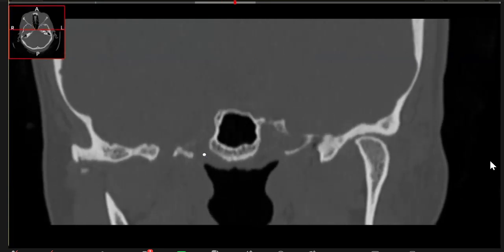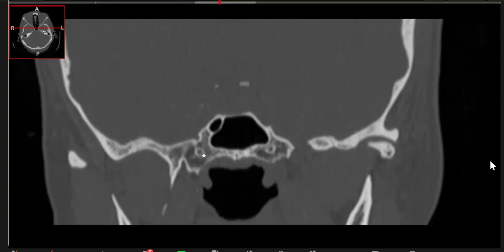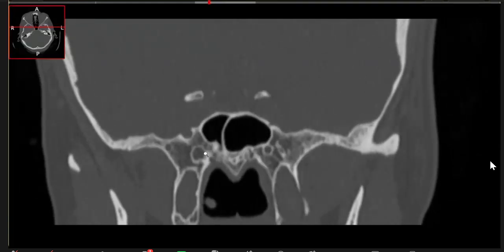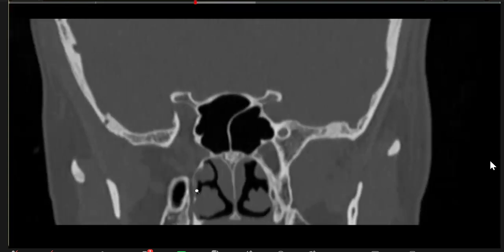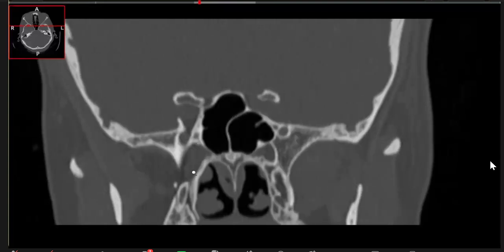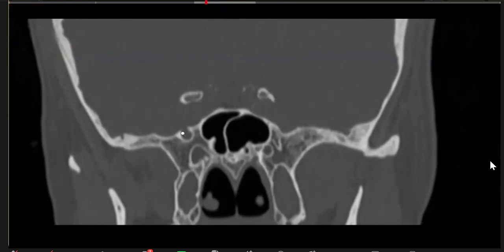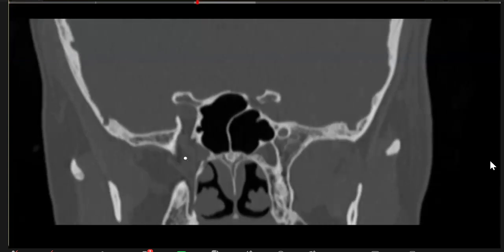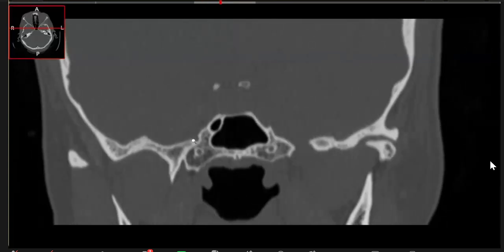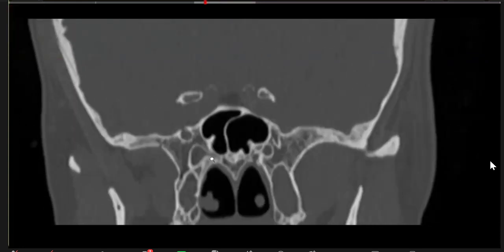So here you are, it opens into the middle cranial fossa. As I'm tracing it anteriorly, look at this. It comes, and then opens into this space. Do you see this? So even on coronal, you can see it. This is the pterygopalatine fossa. Going back, lateral to that will be this foramen, and this is the foramen rotundum. And you can see how it opens here. So this is the foramen rotundum, and this is the Vidian canal, and both of these are for the exam. They will ask you anatomy if they show you this case.